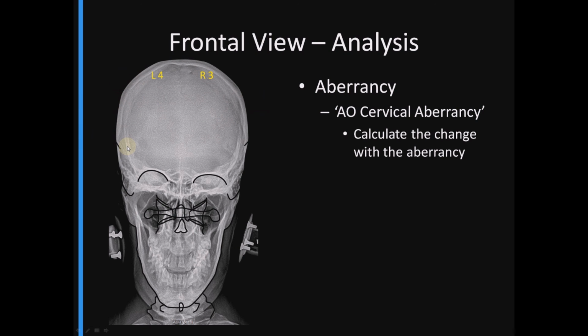We're going to calculate the change between these two as to how the condyles view the area that we zoned previously by subtracting whatever number you have on the right from the number on the left. So it's the left number minus the right number, and then we're going to multiply that times 2.